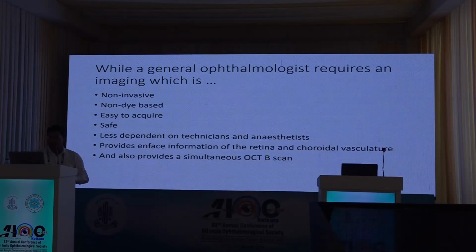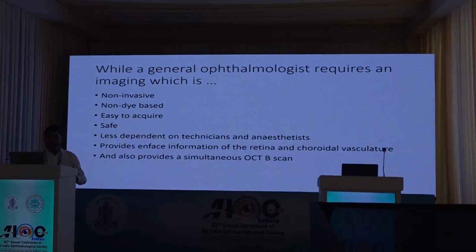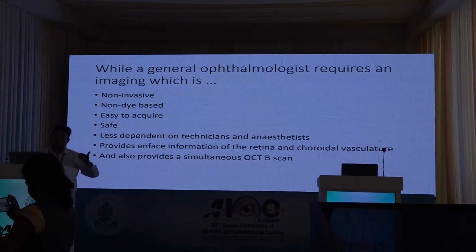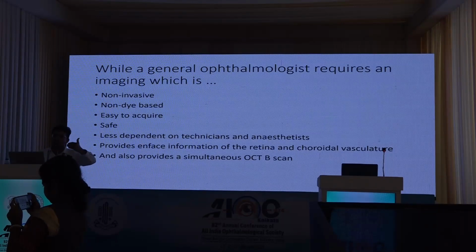While a general ophthalmologist requires imaging which is non-invasive in nature, which is non-dye based, the images have to be easy to acquire, they should be safe with not any exposure to any allergic reactions, they are less dependent on the technicians and the anesthetists, and it also provides en-face information of the retinal and the choroidal vasculature with segmentation, and also provides a simultaneous OCT scan. And this is what a one-stop solution is what you require, where you have the OCT B-scan and you have the en-face imaging of the OCT, where there is segmentation which is happening at the different layers.